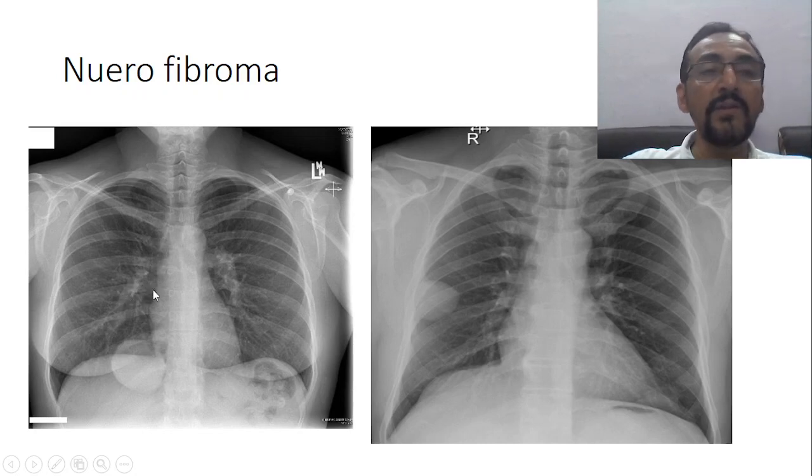And very importantly, you see in this X-ray how these vessels are dividing. We know that the hilum is the area where maximum vessels are present, pulmonary vessels are present, and then arteries are present. Okay, many veins are present. So this area is highly vascular, and the vessels from there will always appear whitish to you. You know that in the last class we have seen it. And see the vessels, how, when they are going upside or downside, how they get divided, they get tapered, isn't it? So very clearly seen here.